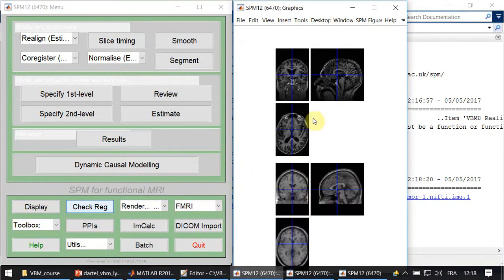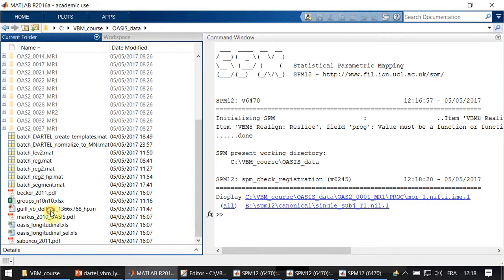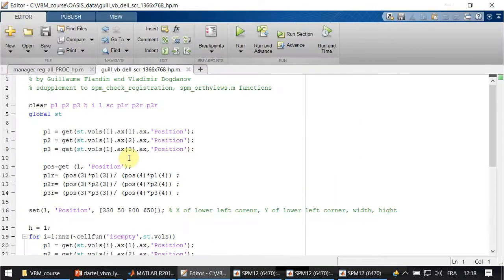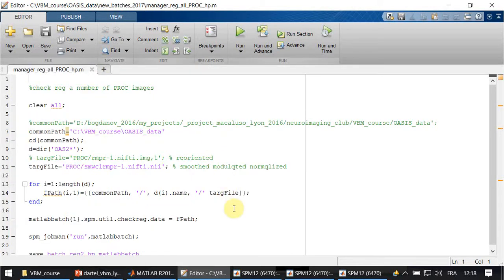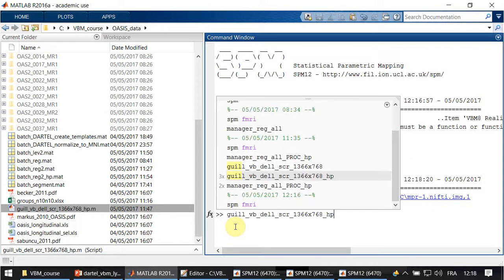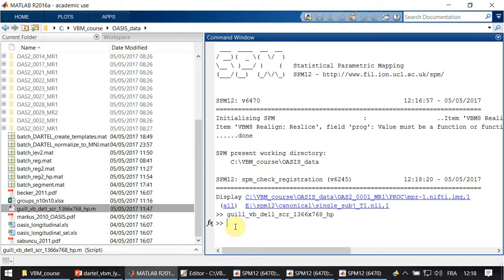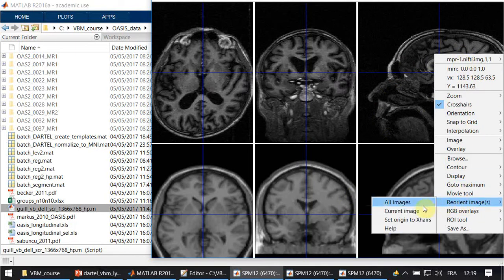Now, this is what I mean. They are tiny and not quite convenient to manipulate. But if you run this little function, I will briefly open it so that you see that it is really short. Nothing complex here. You just acquire the parameters of the figure and you modify it. Let's see if it doesn't fail. Yeah, almost perfect. Now you can see that there is a totally wrong pitch here, and this is what we can correct.